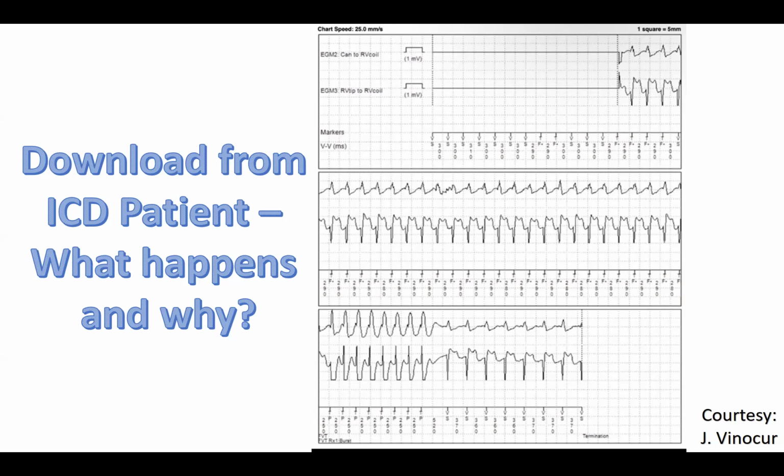So what I would say is it looks like you ramp up into a ventricular tachycardia and then convert back. I don't think it delivered a shock, because I also don't see a pause that would correlate with that. Okay. So basically, you are correct. There's an obvious and big change here in the last panel, from wide to narrow.